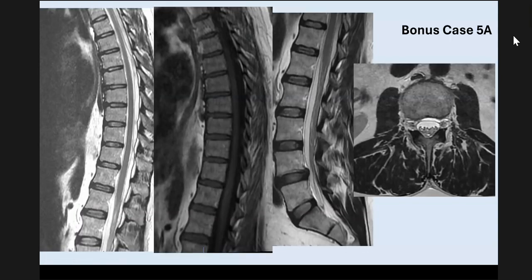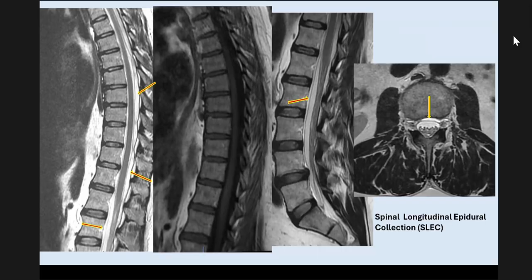Another patient with similar history, the MRI brain. I've not shown you the images of the MRI brain. They had typical appearances of low pressure, but what do we see here? So the spinal imaging is not normal. You do have intraspinal collections, and where is the collection? It is in the epidural space.